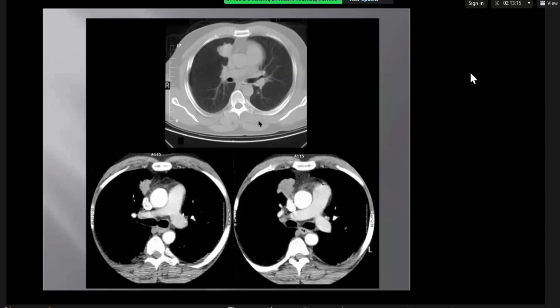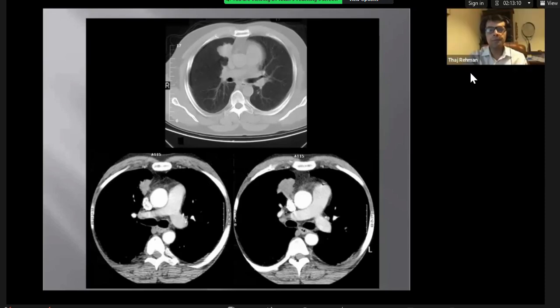A primary lung malignancy would be my first differential. Exactly. Now, you were a bit confused as to whether to call it a mediastinal lesion because of the hilum overlay sign, or a lung lesion. So I will explain why it's a lung lesion, because that's the hilum.